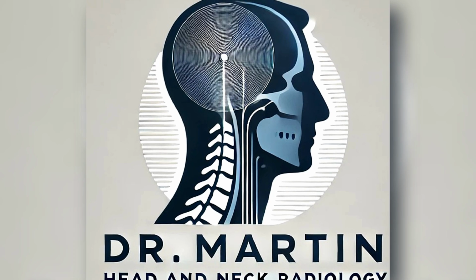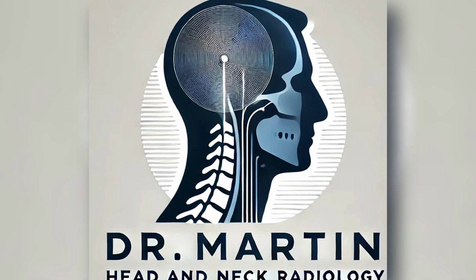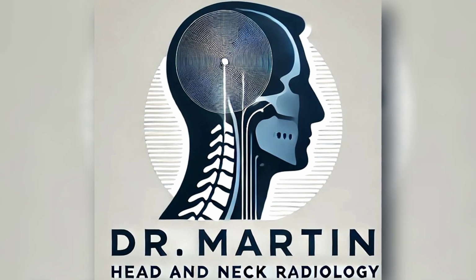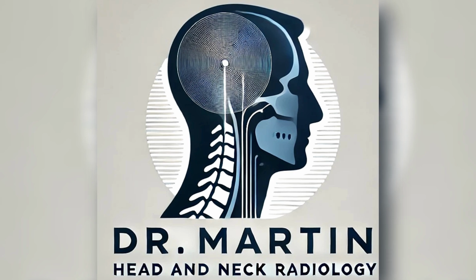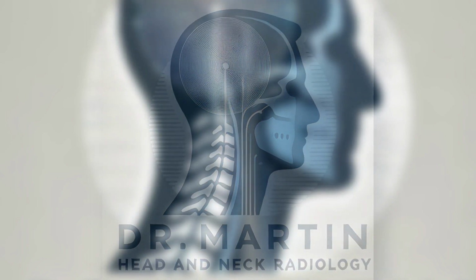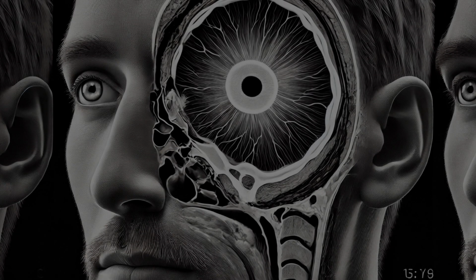In this video, I would like to share two real and educational radiologic cases from head and neck imaging that share the same final diagnosis. These cases are especially relevant because they illustrate classic imaging features of a common orbital vascular lesion and highlight key points for radiologic interpretation in daily practice. Let us begin with the first patient.